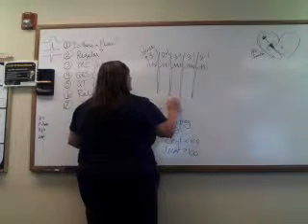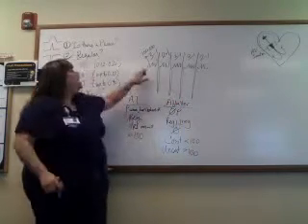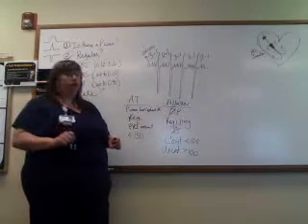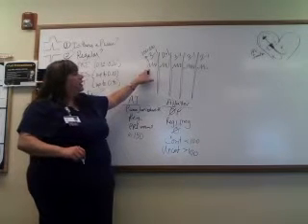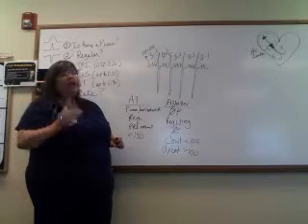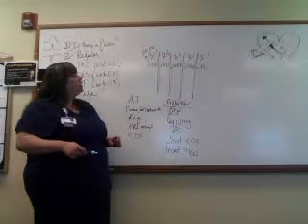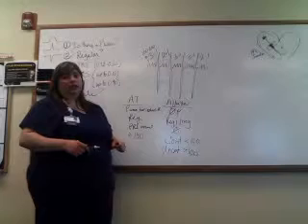So this one is a flutter, atrial flutter. And these are flutter waves. They're also talked about a lot of times like sawtooth or sawtooth pattern because it's one stimulation point that's somewhere down in the AV node and it is firing, but it's malfunctioning. It's firing too fast. So the little guy with the safety net is saying, nope, we're going to not let all the ventricle stimulation through.